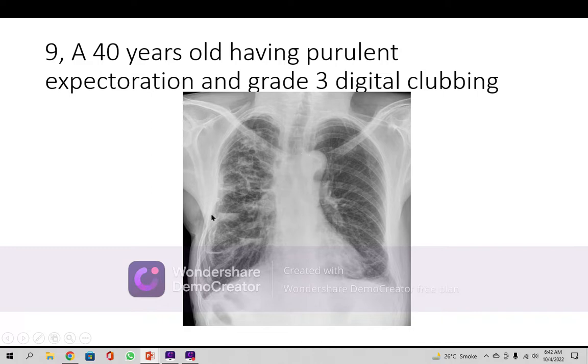The other positive finding is on X-ray. The lung fields are definitely disturbed, abnormal. Bronchovascular markings are crowded on the left side here. See most of it. And on the other side, the thickened bands of fibrosis are seen, the reticulations.